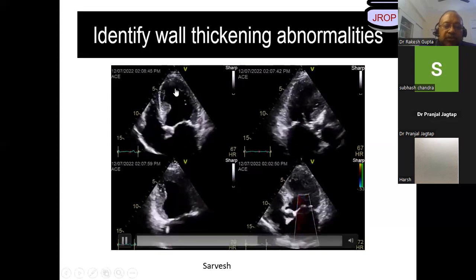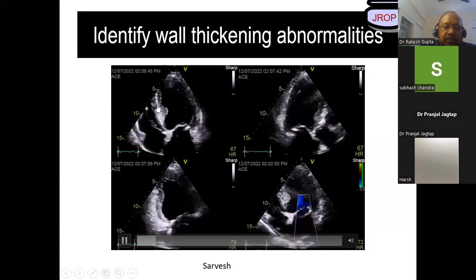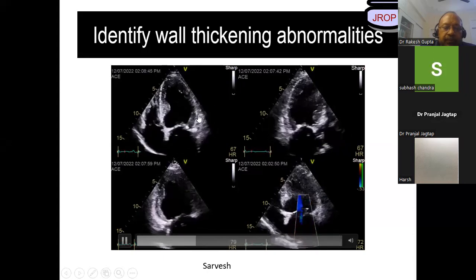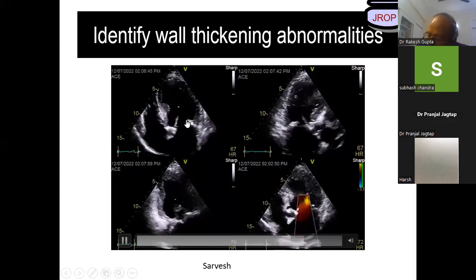Now, just go to this first clip. Just tell me one single abnormality, the rest I'll ask from other people. You can look at all three views and tell me one single abnormality. I'm not going to ask you more than that, Pranjal.